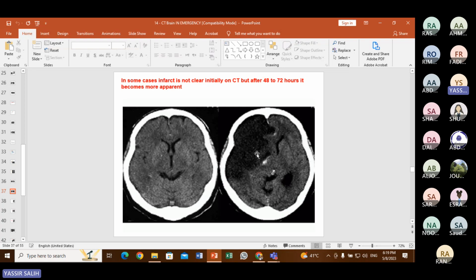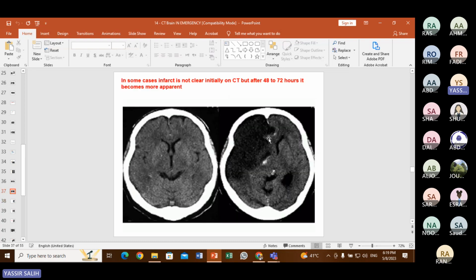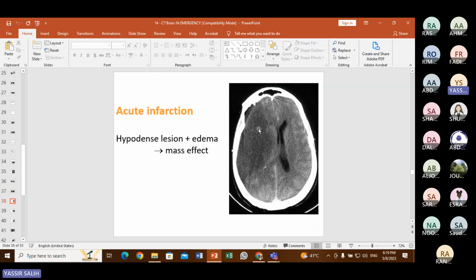This is an infarction, acute infarction. ليش acute infarction؟ Because there is a midline shift or mass effect of compression of the lateral ventricle. This is also acute infarction. ليش acute infarction؟ Because it is a hypodensity confined to the cortical distribution with mass effect. دائما in acute infarction بيكون hypodense لكن عندها mass effect. يسموه positive mass effect لأنه هنتكلم بعد شوية عن النيجاتيف. This is positive لأنه عامل compression of the lateral ventricle and midline shift. This is a positive mass effect. Hypodense lesion with mass effect.